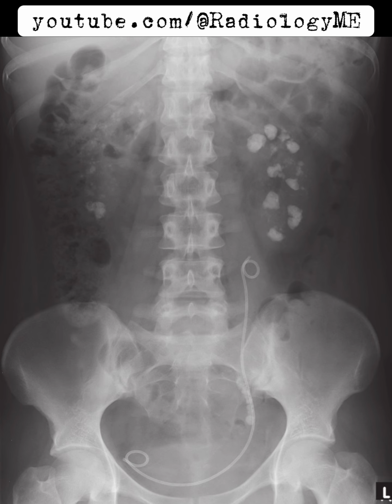So what's going on here? This is a case of medullary sponge kidney with migrated ureteric stent and Steinstrasse formation. Now, the next steps would include discussing this case with urology to figure out what to do about that stent. I'd also recommend an ultrasound to check for any hydronephrosis, just to make sure the kidney isn't getting backed up with urine due to the stent migration.